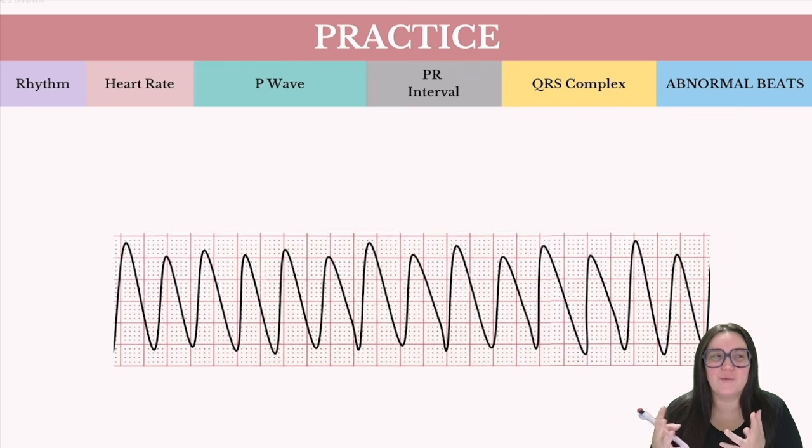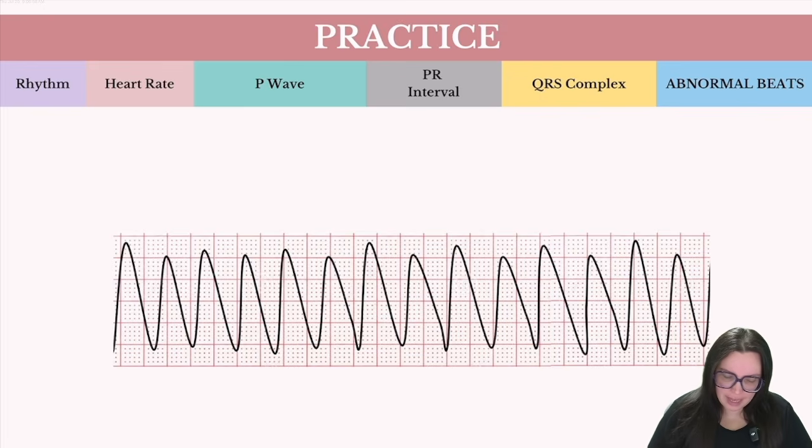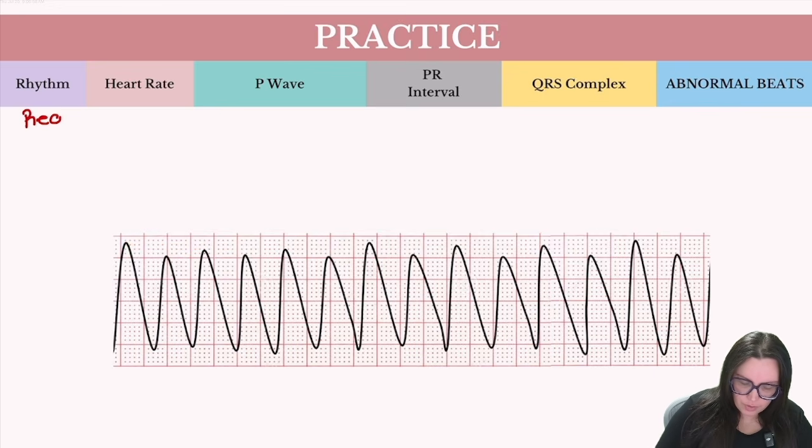So let's do some rhythm identification practice. We have our first rhythm here. Is our rhythm regular or irregular? Well, if I was to actually march this out, you're going to see it falls in the exact same place every single time. So we're going to call this rhythm regular.